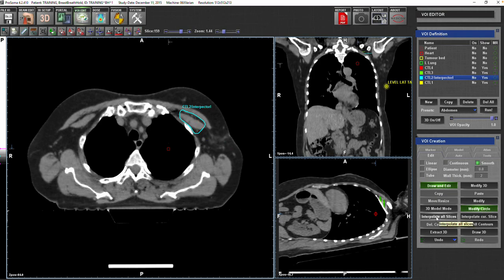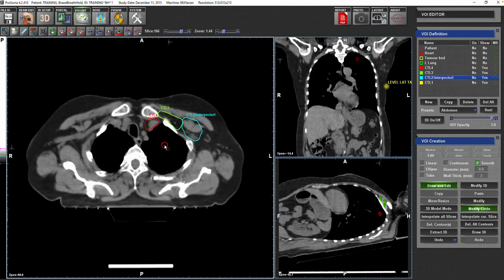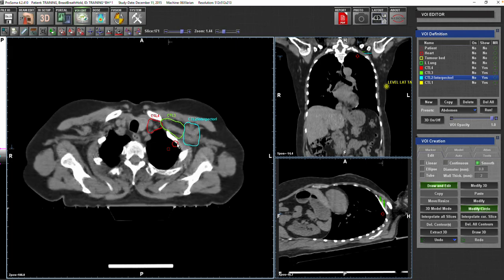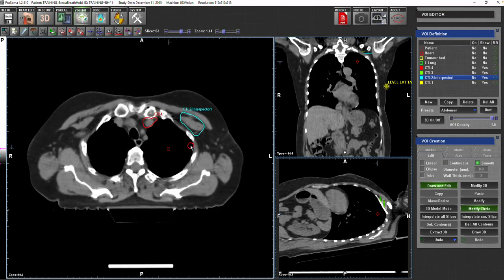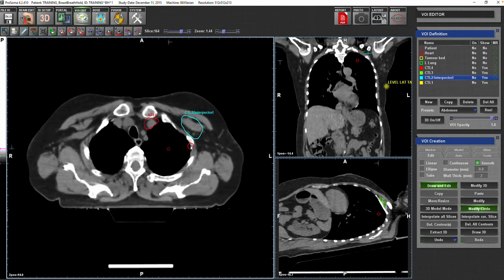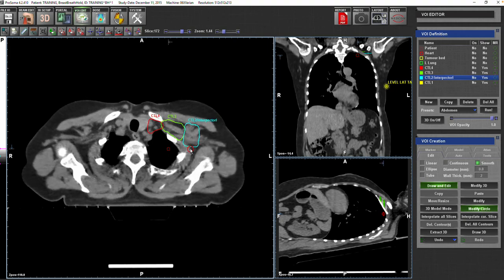I will do the same, and I will interpolate, and what you will see now is that you will like what I'm talking about. Again, you may see some kind of a space that you need to maybe push a bit, but it will never make any difference when it comes to your field-based anatomy, and I will show it to you.